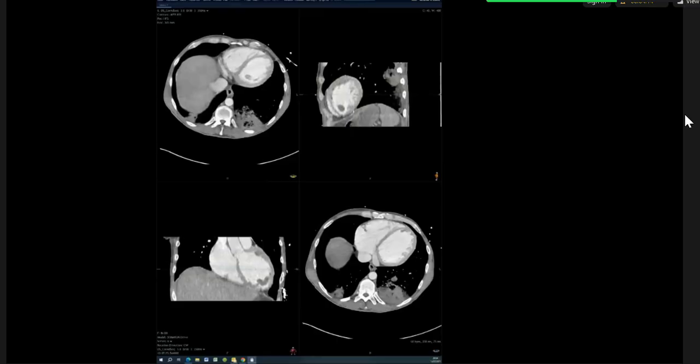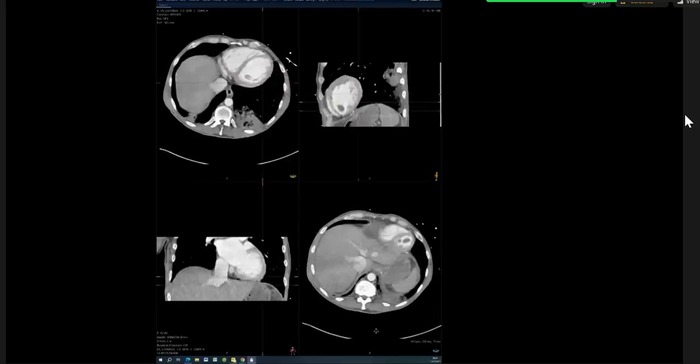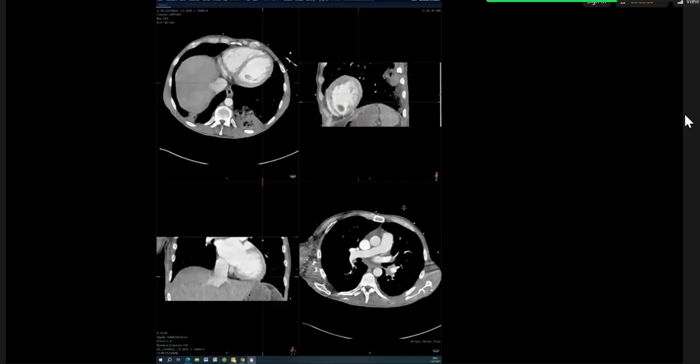What causes of thrombogenesis or increased risk of thrombus? Atrial fibrillation would be one. Is there a myocardial infarction or an aneurysm secondary to previous infarct? Actually looking at the cardiac wall, is there some thinning, I could be overcalling here. Yes, dilatation because he's in heart failure. It's just a dilated LV.